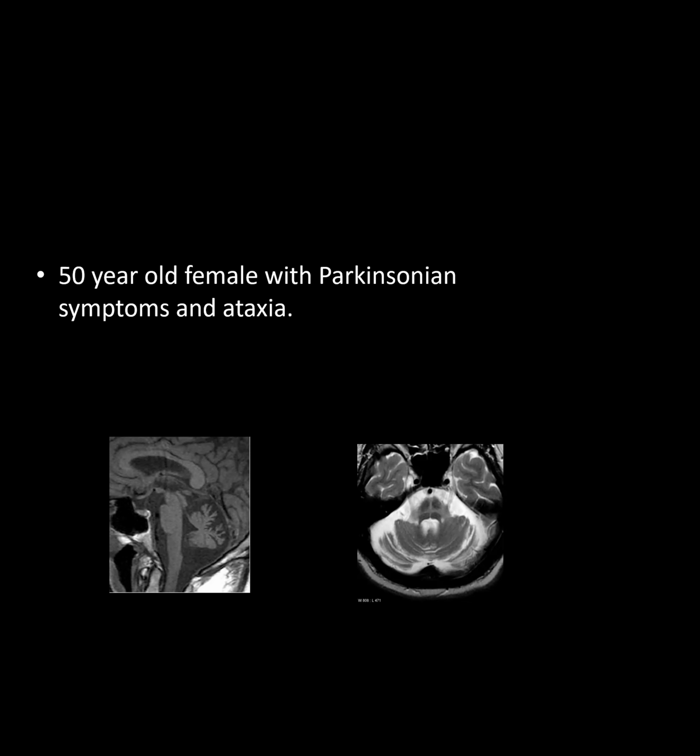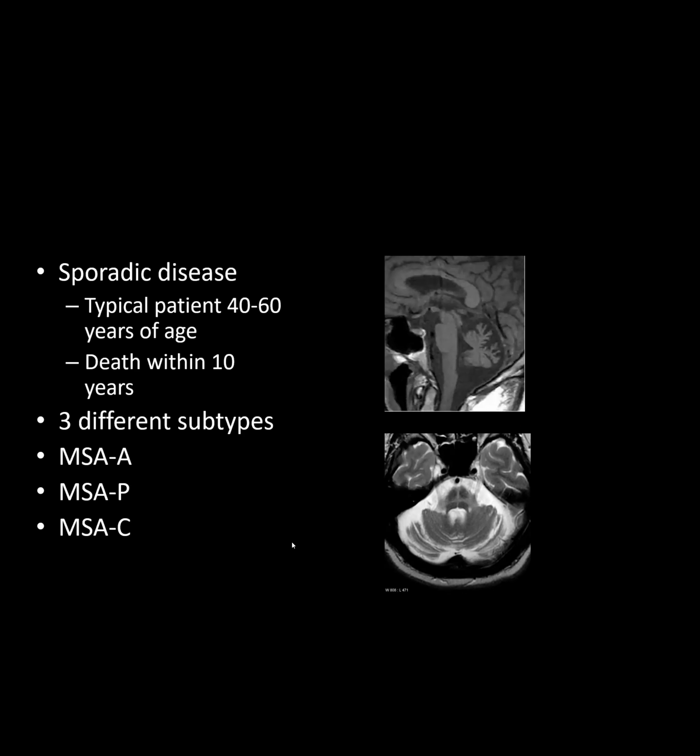Okay, how about the pons? Is that normal, or is there volume loss there too? Pontine, yeah, there's a lot. Yeah, it's kind of flat actually. So cerebellar and pontine volume loss with that hot cross bun sign. This is kind of a classic appearance for multiple system atrophy.